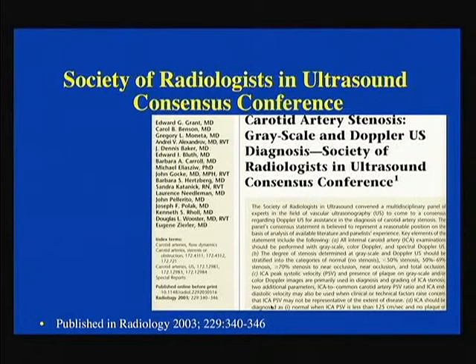Okay? Also, you can use the common, internal to common velocity ratio to further qualify the lesion if you feel uncertain. If it's a patient who's younger, who has a higher cardiac output. So you're allowed to use a combination of the criteria, your cut points, for a good reason. And you give the physiological reason in the report. And if you're a sonographer, you explain with a short note what you saw. For example, you'll remind your interpreting physician, because we know they need to be reminded, that this is a young patient, and because of that, the velocities are higher. This is what you need to do, give it in context.